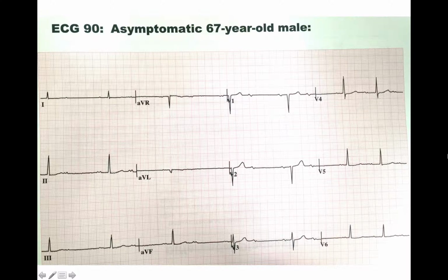Hi, my name is Julia, and I am a third year medical student rotating with Dr. Ben-Zur. Today I'll be going over second degree AV blocks, also known as Mobitz type 1 and type 2. So let's look at this EKG first.